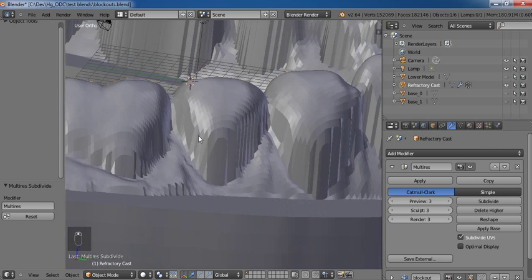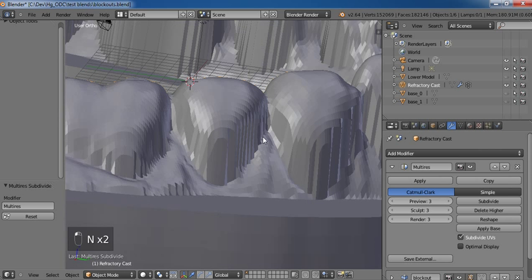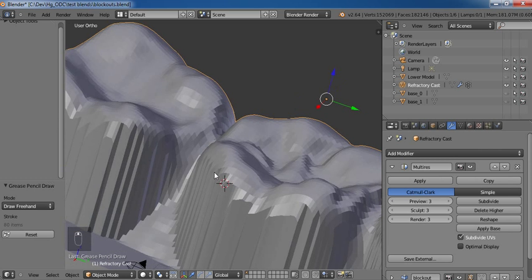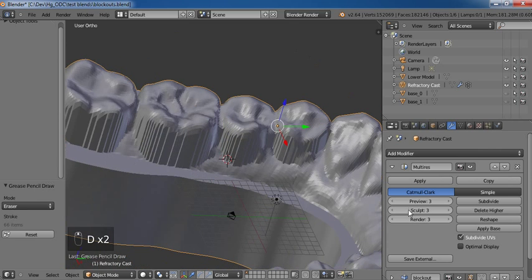As you can see, in the areas where you're blocking out or dropping off the edge of a height of contour, that's going to be kind of where you're not as accurate as you want to be because of the discrete nature of dropping a mesh down onto another mesh.